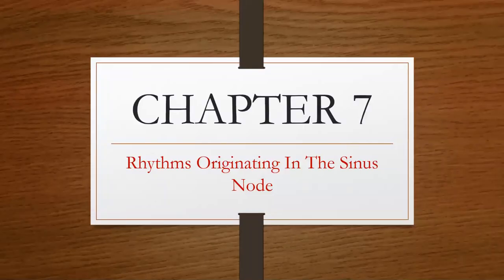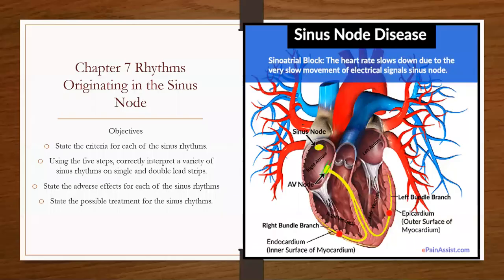Hi, class. We're on chapter 7, rhythms originating in the sinus node. Chapter 7 starts on page 72 for those who want to follow along in their books. Here's an image of your sinus node firing.